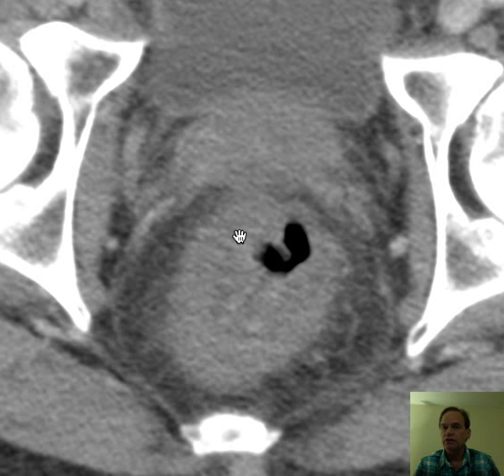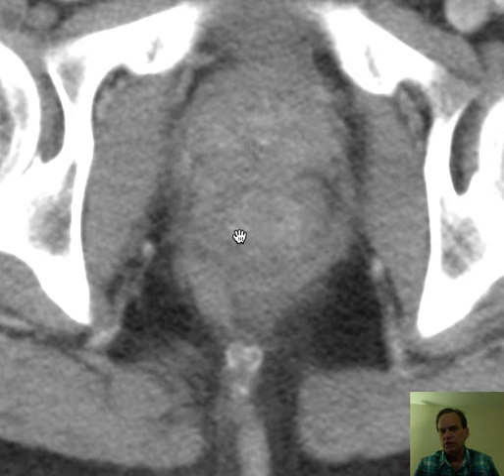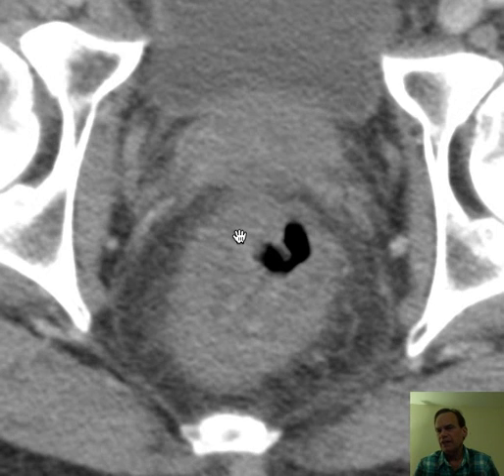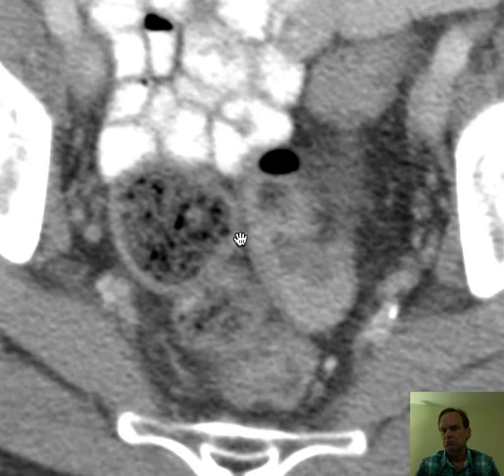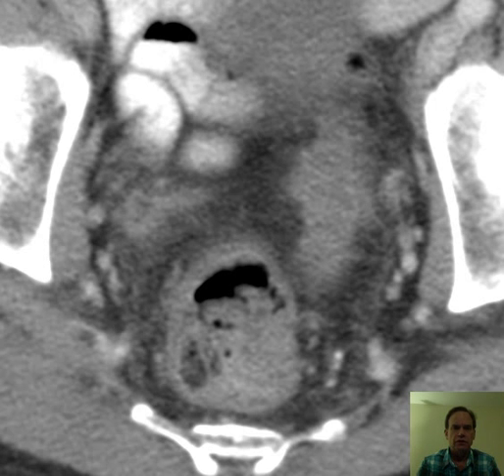We usually think of small bowel involvement when we think of Crohn's disease, and that's usually the case, especially the terminal ileum. Far and away the most cases of Crohn's disease I see have that terminal ileitis, with edema, thickening and stranding at the terminal ileum. It may be a little bit here and there also, but it almost always involves the terminal ileum. But we're told sometimes it can involve the colon. I've seen that a couple of times. Since this is recurrent in a Crohn's disease patient, I have to believe this is Crohn's involvement of the rectum. So, a fairly uncommon process.